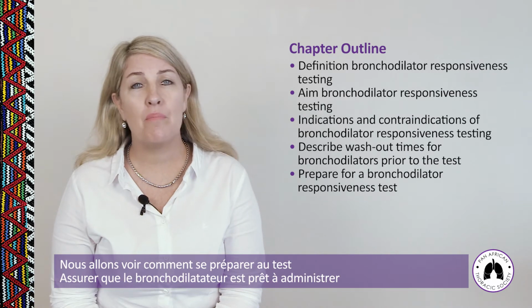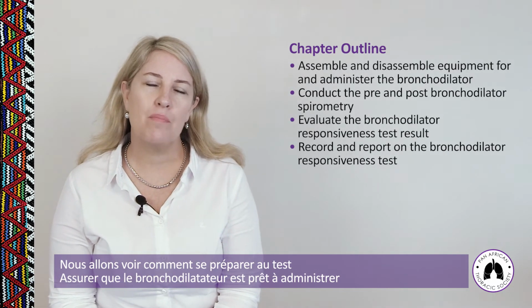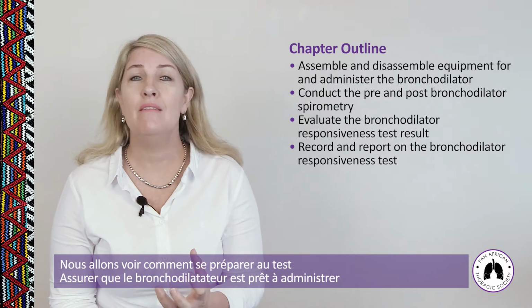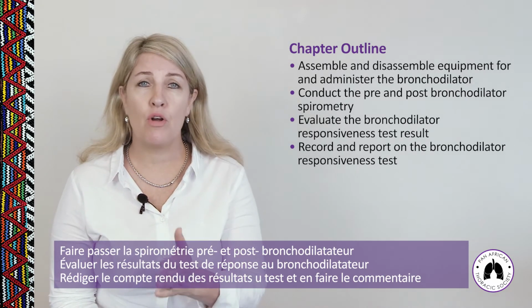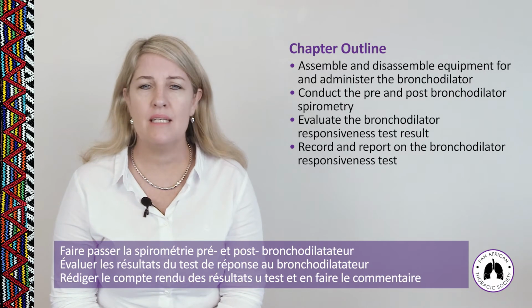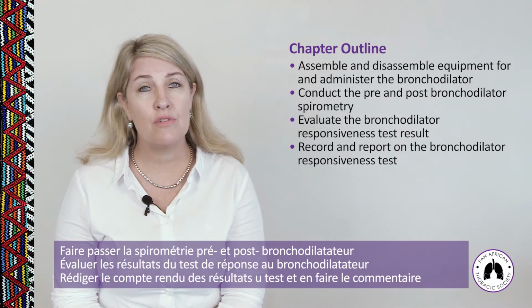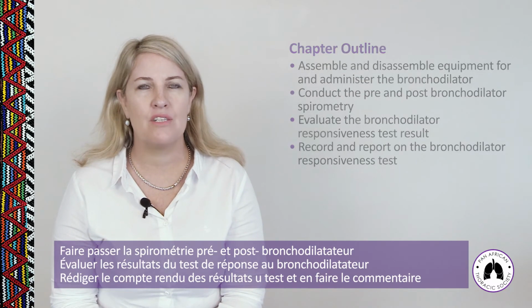We'll also look at how to prepare for the test, how to assemble and disassemble the equipment for the actual bronchodilator administration itself. We're going to talk about conducting the pre and post bronchodilator spirometry test, evaluate the bronchodilator responsiveness test result, and then record the bronchodilator responsiveness test result.